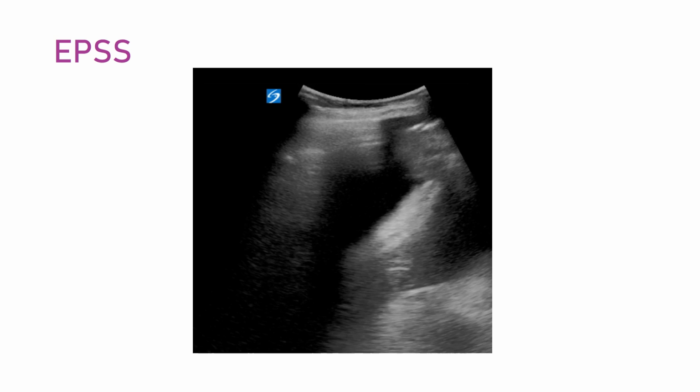So let's jump into some conclusions about detecting free intraperitoneal air by ultrasound. We know that only a small volume of free air can already be detected by ultrasound. Of course, this depends greatly on the examiner himself and some patient characteristics. CT scan remains the gold standard for the detection of free air. But whenever you have your ultrasound machine with you for a patient with abdominal pain or who is in shock, the finding of the EPSS can change your opinion and help you greatly for the diagnosis of this patient.